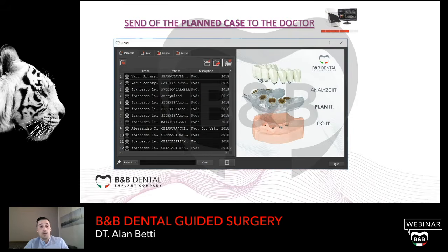The cloud works by mail, and we can send the project to your mail and the doctor's mail, and the doctor can check the position of the implant, the sleeves, the abutment, the lateral pins, everything in the project plan.